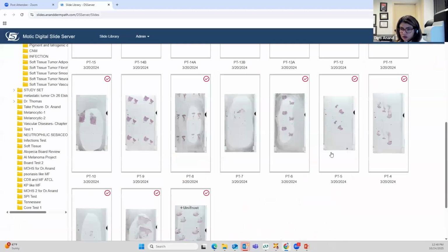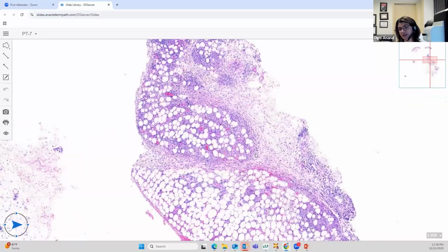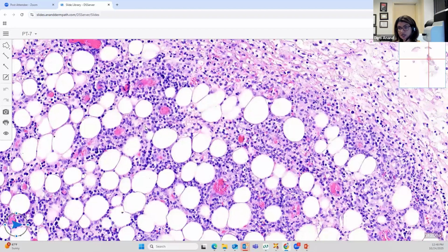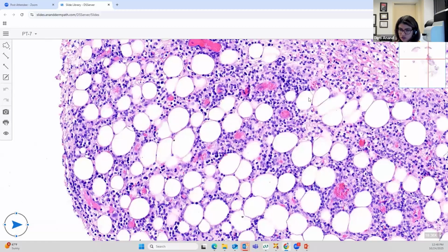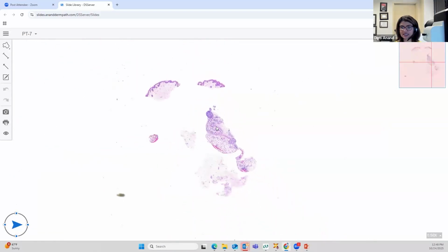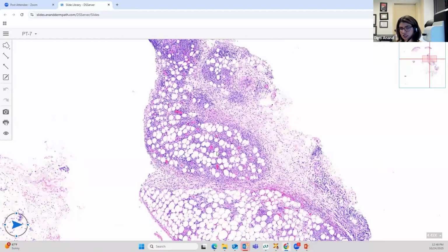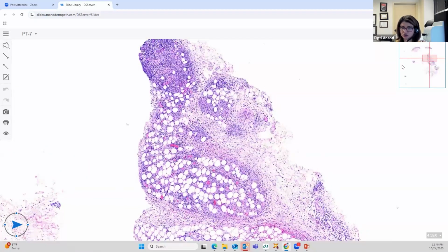Another thing which I wanted to talk about E. induratum is that typically when you biopsy lesions of E. induratum, the fat kind of falls apart, okay, because it's very necrotic. It's not infectious, but it is very suppurative. There's lots of neutrophils and necrosis. So the fat kind of falls apart. So by the way the biopsy lays out on the slide, you can have a first-hand impression whether you're dealing with PAN or E. induratum. There are multiple lobules separated out, fallen apart, very dirty looking. That's when you think about E. induratum.